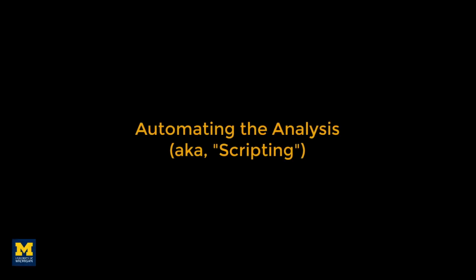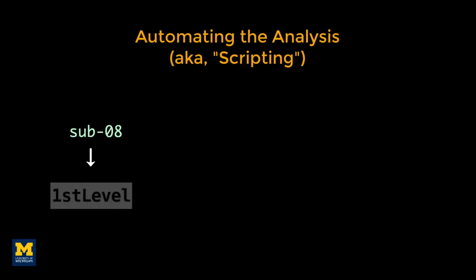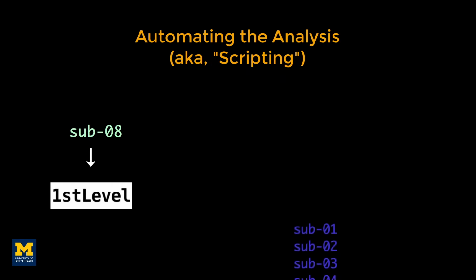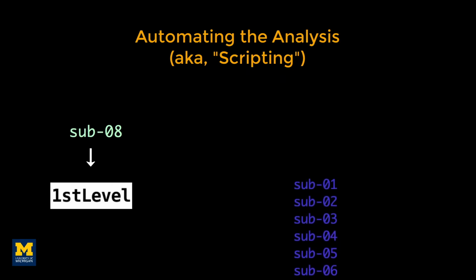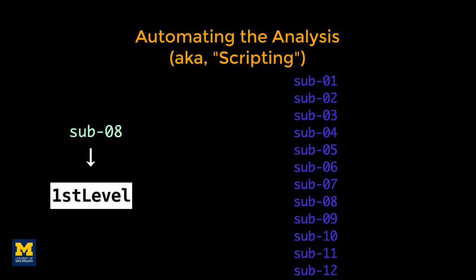After you've preprocessed and set up a model for a single subject, you'll need to do the same steps for all of the subjects in your data set. This may seem tedious but doable. We have only 26 subjects and only 2 runs per subject. An alternative, however, is to script your analysis.